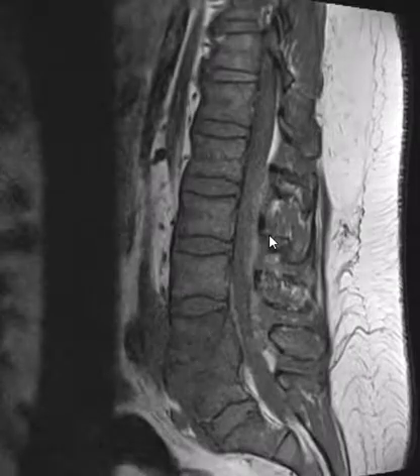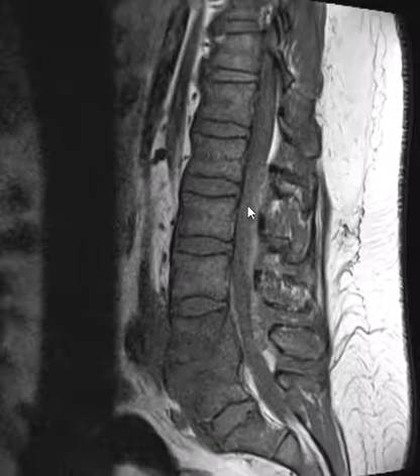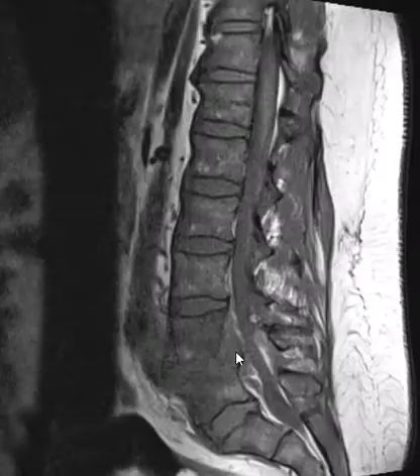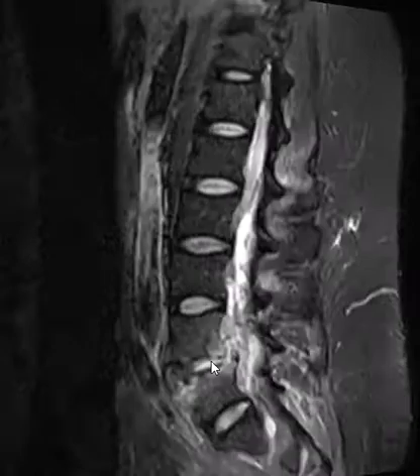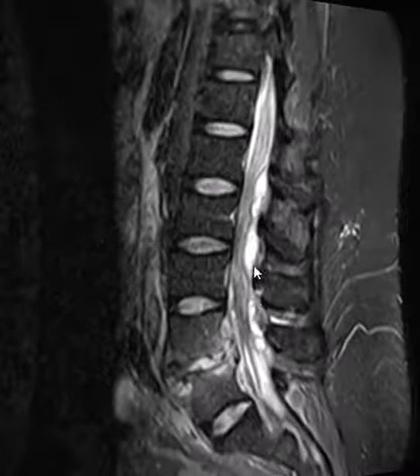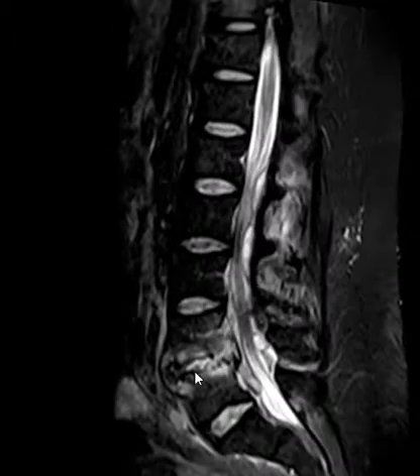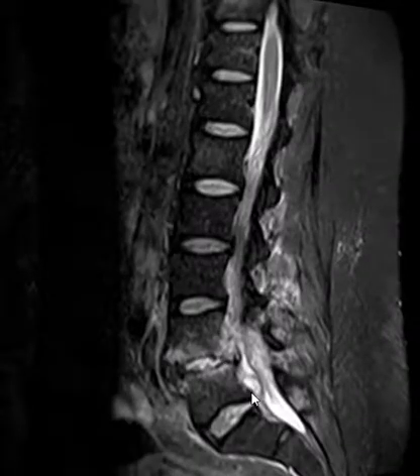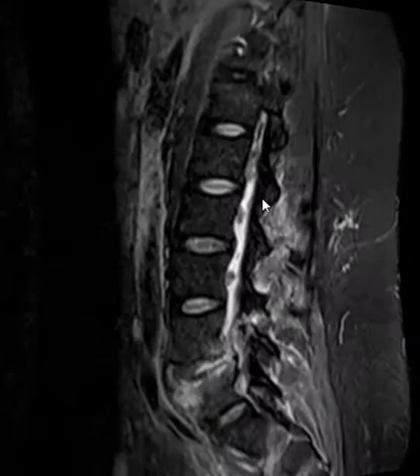About a month later, here's a patient a little bit older than the last one, still a middle-aged male, and they have very similar findings. You can see there's a discitis, osteomyelitis. Infection extends both posteriorly into the epidural space and anteriorly here. And this also had an epidural abscess here in the back that went all the way up to L1, this lobulated fluid collection. So really significant findings of discitis, osteomyelitis, bone destruction, and epidural abscess that goes down here in the front and in the back all the way up here. So this is our second case.